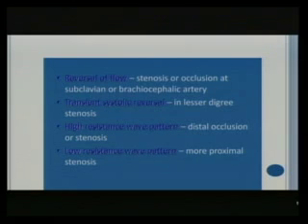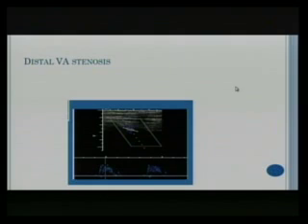So if you're looking at the proximal vertebral artery and you see a high resistance waveform, you automatically know that downstream, somewhere in the vertebro-basilar system, there is an occlusion or a stenosis. And if a vertebral artery becomes more low resistance than it already is, you know it's a proximal stenosis, and this is a tardus parvus waveform. So these principles are very, very universal, and they apply from head to toe in any arterial system, and all of you are very well versed with that.